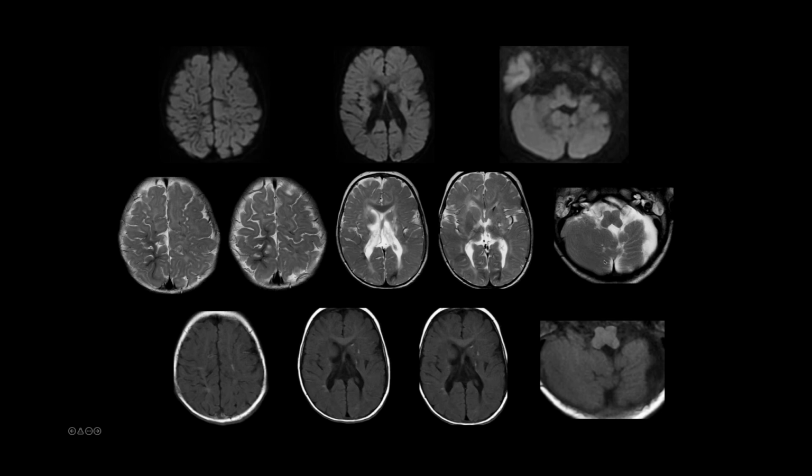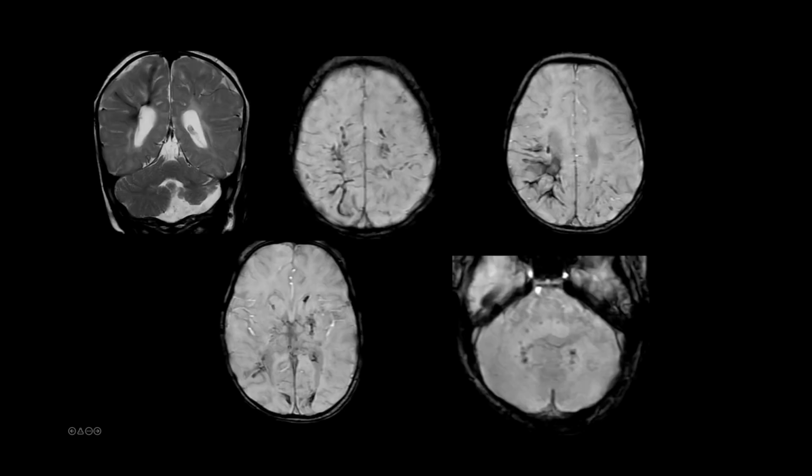The cerebellum demonstrates asymmetrical appearance. There is some hypoplasia of the left cerebellar hemisphere in comparison to the right. On the coronal images, again, you can appreciate the hypoplastic left cerebellar hemisphere. There is slight thinning of the cortex in the left cerebellum. You can appreciate the hypointense change on the T2 weighted sequences. And on the SWI sequences, we have the expected areas of blooming corresponding to the T2 hypointensities. These can probably be hemorrhage or calcifications. And also the posterior fossa demonstrates foci of blooming, suggestive of probably old hemosiderin deposits.